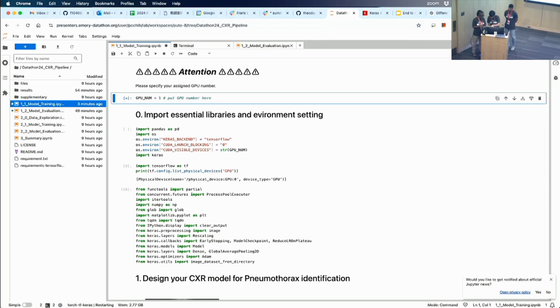In our GitHub, maybe you can go to our repo, the repo itself, and scroll down. So that means we have to follow these steps. Let me try this.